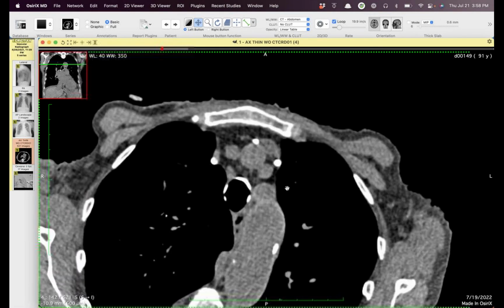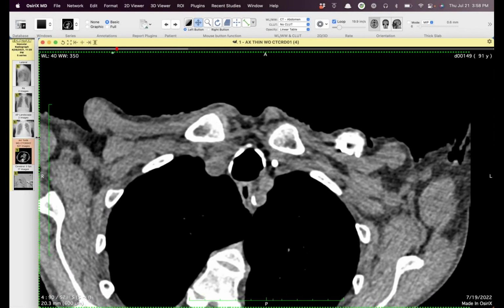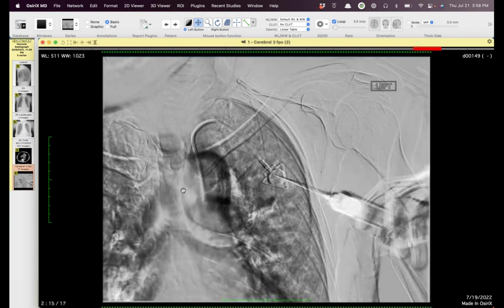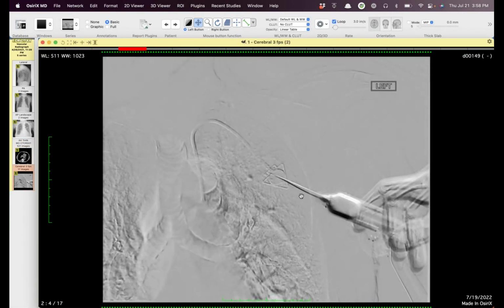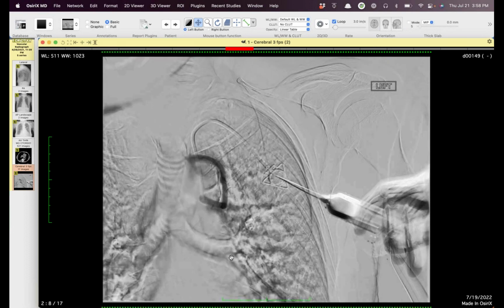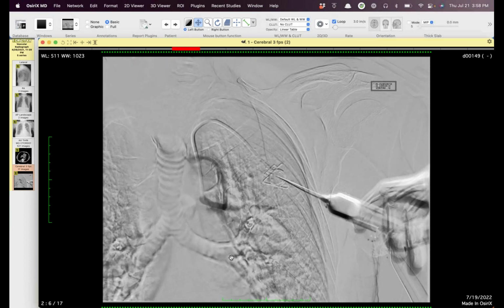Did you see the arthritis in that interventional guy's hand? Let's see. It's a young hand. It doesn't look like there's much. I was actually focused more on the tracheobronchial calcification here.